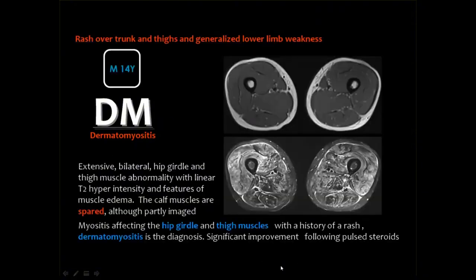And here you can see the appearance of the normal thigh muscles, and this is the appearance of the muscles affected by dermatomyositis. And here you can see the diffuse muscle edema, and you may feel that there is some subcutaneous edema as well.